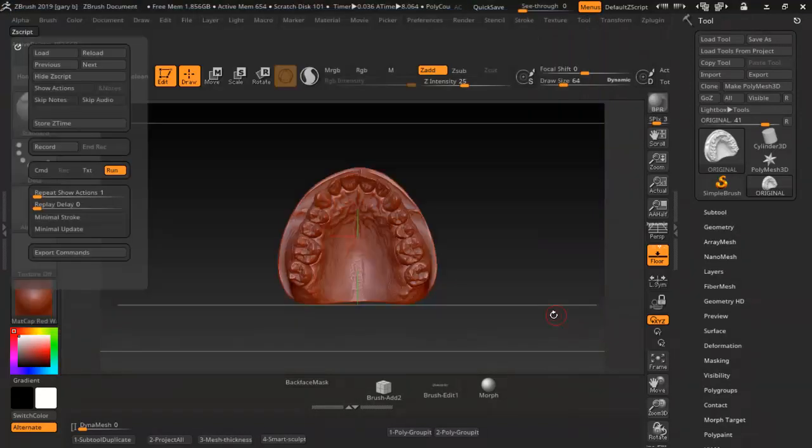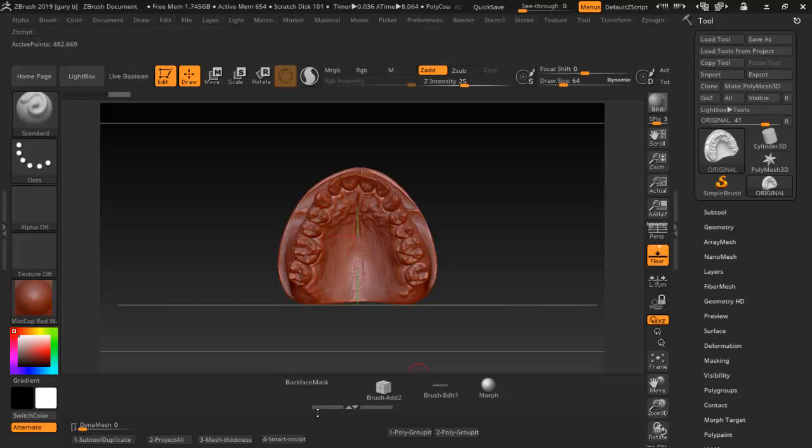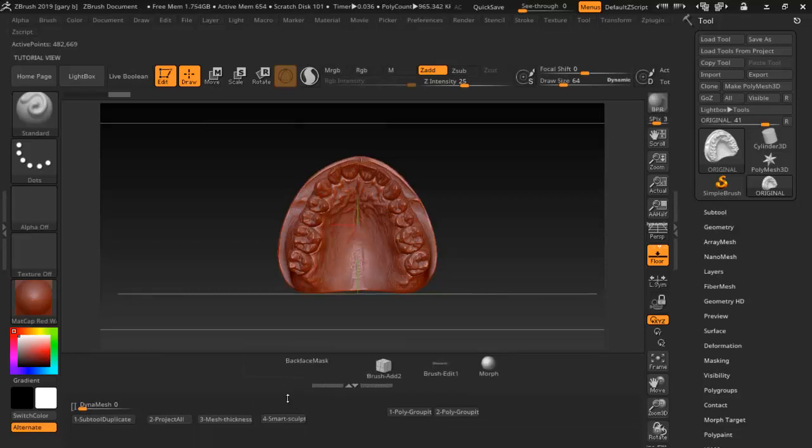All right, once you load that, you'll have these buttons down here at the bottom. They're grouped. It starts with 0, then 1, 2, 3, and 4. You can see the numbers in front. That's how you do them in order. And here's another set of groups over here, 1 and 2. Okay, we'll get to that here in a second.